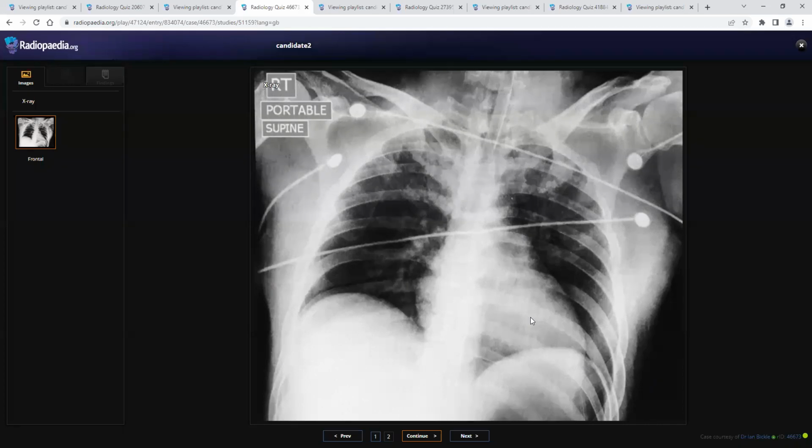So first of all, I need to search for fractures. Yes, Dr. Anil, I can hear you. I'm searching for fractures now. Ribs are fine. I can see no evidence of bone fractures. But this bilateral upper lobe opacities may represent lung contusions.